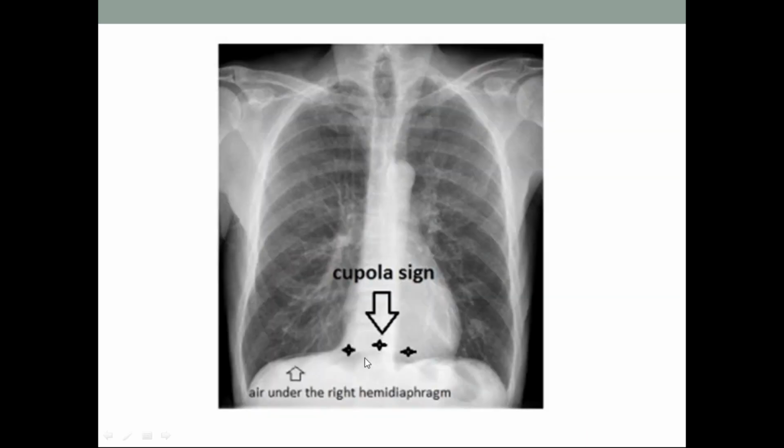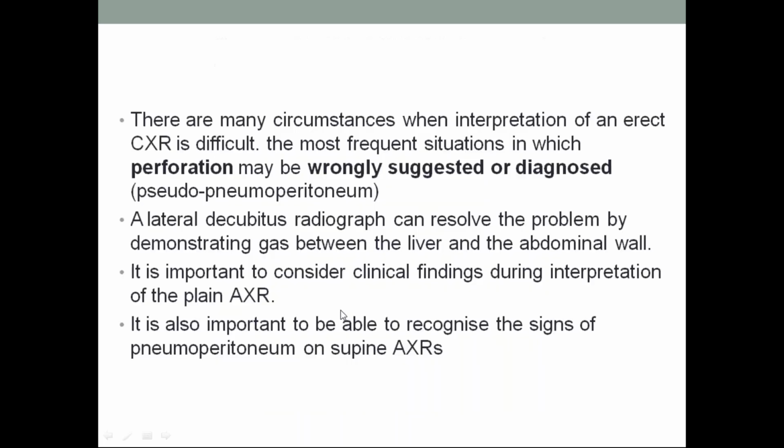And this is the cupola sign. This is air under the right hemidiaphragm, and also seen in the same way below the central diaphragm. This is the cupola sign. Please make a note. This is a very important sign.